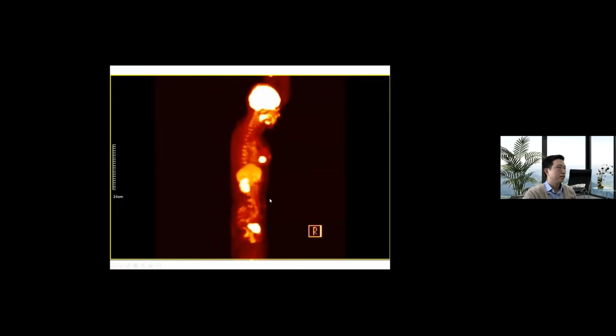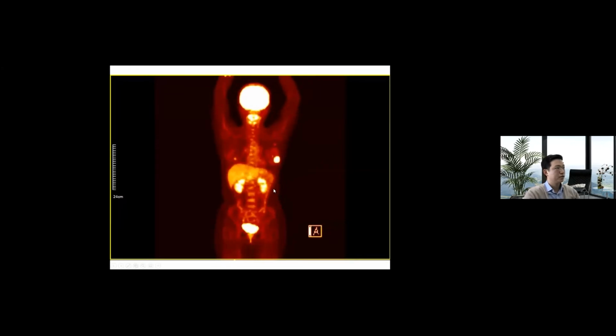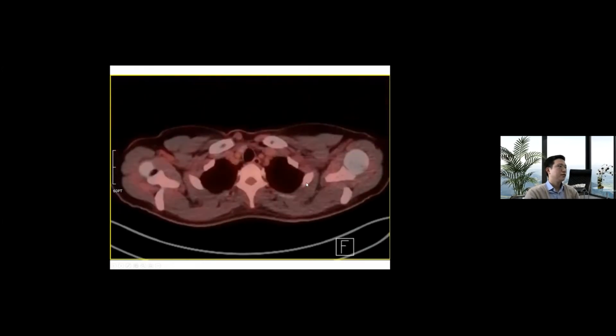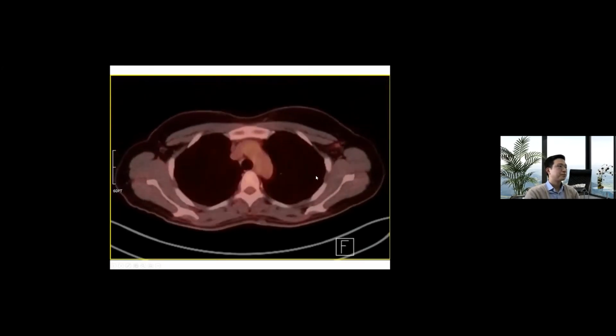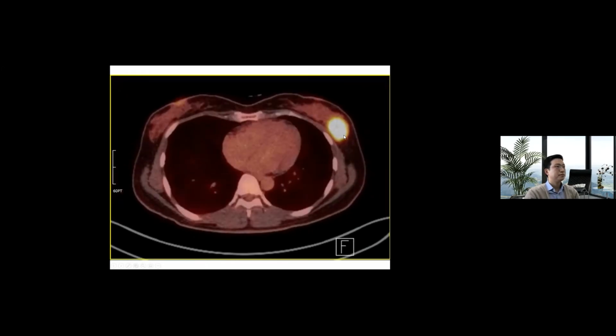And otherwise, I don't see any suspicious lesions from the MIP. Let's see the transaxial image. And you can see the bright primary tumor here.